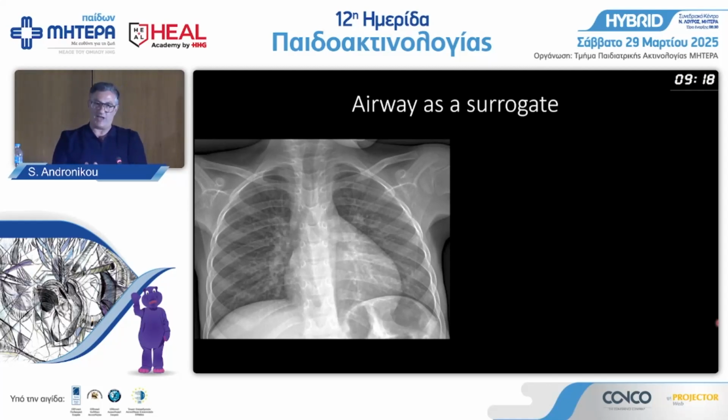I believe the airway is the most successful way to know you have lymphadenopathy, because the airway is the only dark thing in the mediastinum. Okay? So you can watch if it deviates, and you can watch if it compresses. So I'll give you some examples. That's the main parts of the airway. I'm just talking about the proximal parts of the airway, not the distal airways.